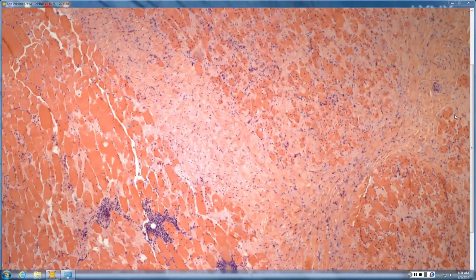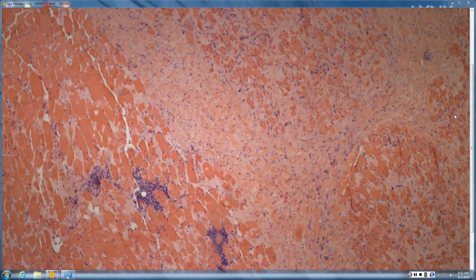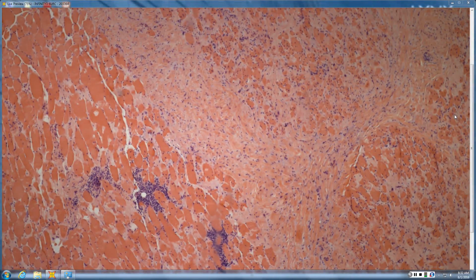This was negative with a pan-keratin. So James, your stain was totally negative. Poor stain choice. Keratin 903 and P63 were massively positive in every last spindle cell all through the muscle. So, a monstrous desmoplastic squame, just like desmoplastic melanoma: collagen-producing spindle cells, lymphoid aggregates. This one was S100 and SOX10 negative, keratin 903 and P63 positive. Okay, that's it.